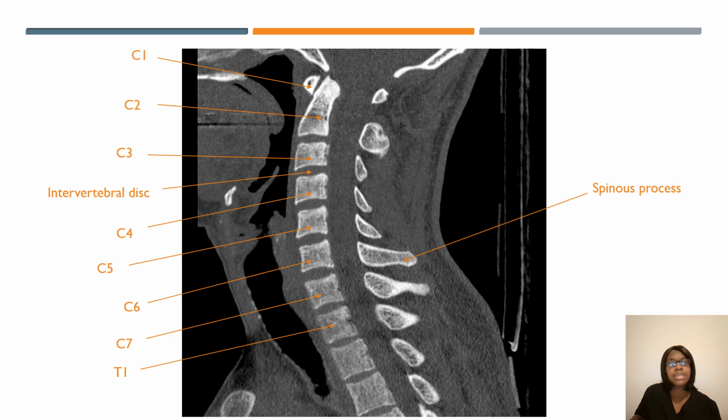More anatomy I was telling you about. This is how it was set up for a cervical spine and how I would scan it. Make sure that you are getting C1 in there. Do not clip that. I always scan down to mid T1. So whenever you come to this video, you can just pause it and use it as an anatomy review for you.